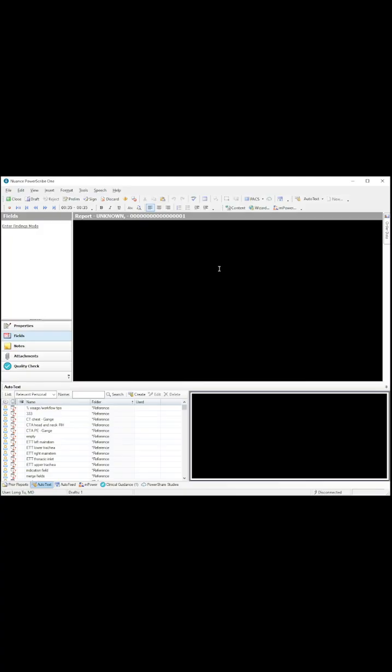If you can build some familiarity and try to do that, and then also steal and clone macros, that's probably the most important thing when you start. Just steal other people's stuff. And when you need something that you can't find that someone else has already made, make the first couple of baby steps to creating your own things, then you will be well on your way to improving your efficiency and the reproducibility and perhaps completeness of your reports. All right. Thanks for listening.